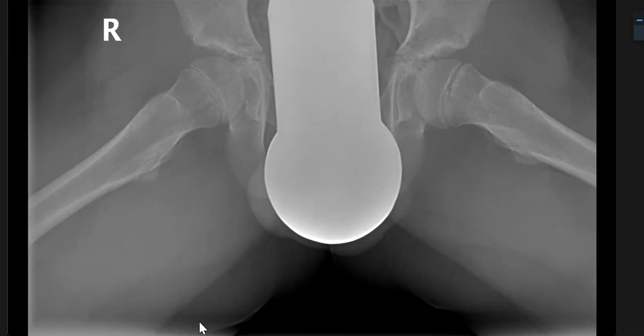I will alert the referrer and advise orthopedic consultation for the patient. It is most likely dealt with by pinning, and the patient will need counseling and further follow-up radiographs to look for any development of secondary osteoarthritic changes, which are not present in the current study.